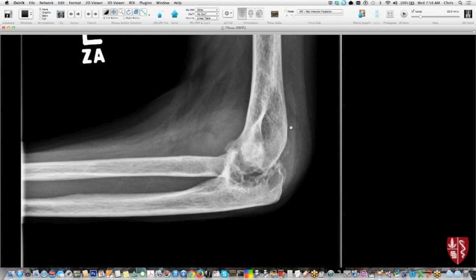Yeah, rheumatoid arthritis. And so this is actually a pretty good example of that, where pretty aggressive, if you will, rheumatoid arthritis with pannus and cartilage destruction. And once the cartilage is destroyed, then that pannus just goes and kind of continues to erode away the bone. So it can progress pretty quickly.